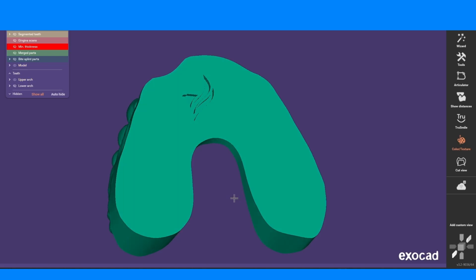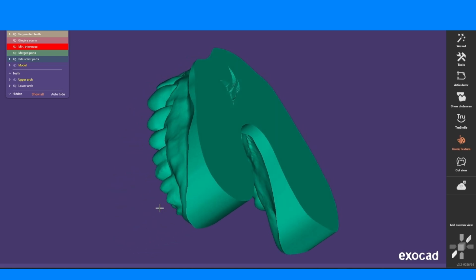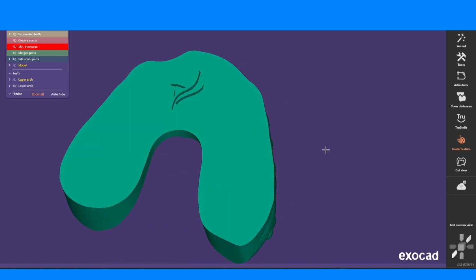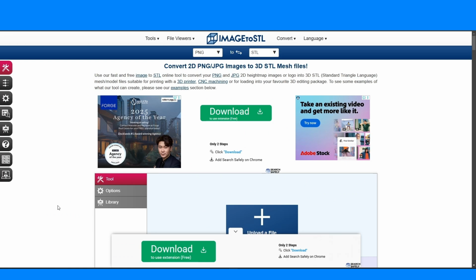Hi everyone, in this video I'm going to show you how to engrave your logo into the model using Exocad. As the first step, you have to convert your 2D image into a 3D STL file. And one quick free way to do that is using this website, image to STL.